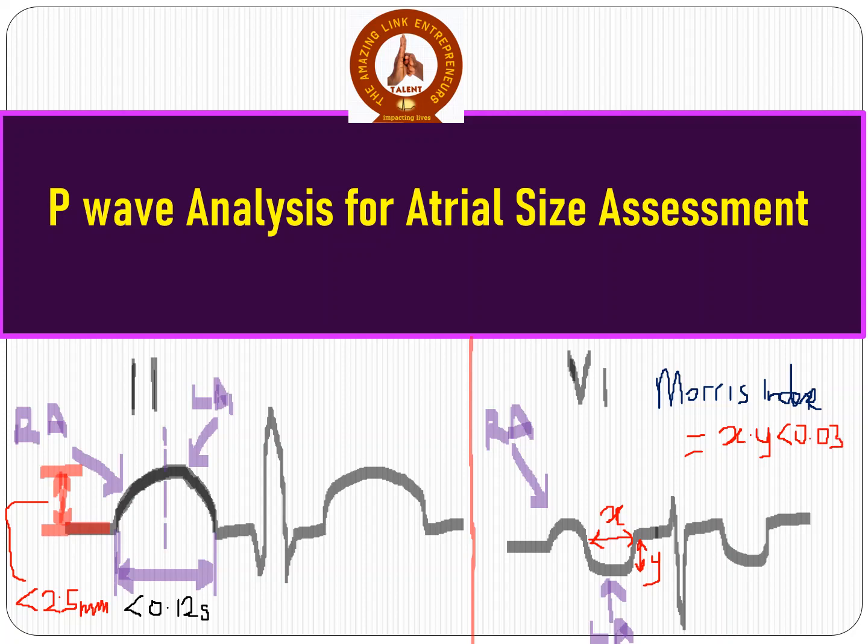The unit is millimeter seconds, since the duration is measured in seconds and the depth is measured in millimeters. That is the normal configuration and presentation of the P wave in V1.